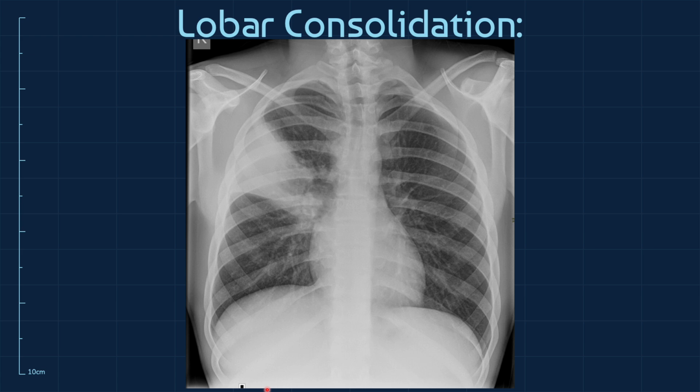And that's a common mistake that happens by medical students and younger doctors because they forget that you are looking at a 3D object in a 2D view. And although it may appear in the middle lobe, you can't see the horizontal fissure on top of the consolidation, but rather in the bottom of it. So the consolidation actually cuts off more horizontally here, and that means that this is all in the upper lobe. If it were to go straight and then grow below, then it's more likely in the middle lobe.